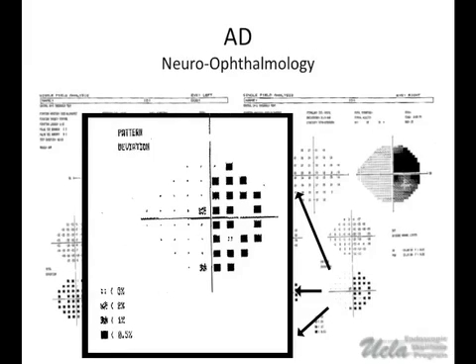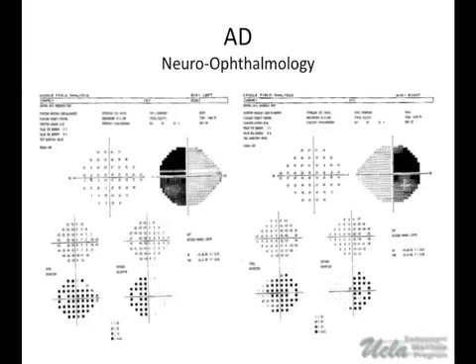And this probability plot actually tells you the statistical probability that that will not occur by random chance. So the black squares mean that there's a very small random chance that it's going to be abnormal. So the black squares are the more abnormal things. So rather than looking at this, which is kind of hard to interpret unless you really look at a lot, these data points are the easiest.